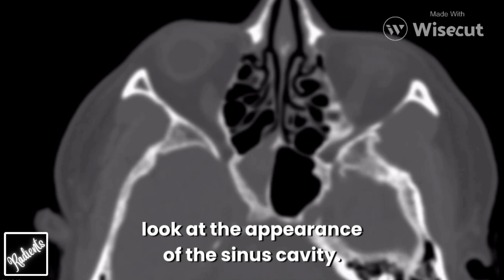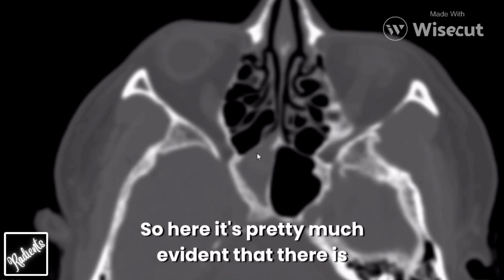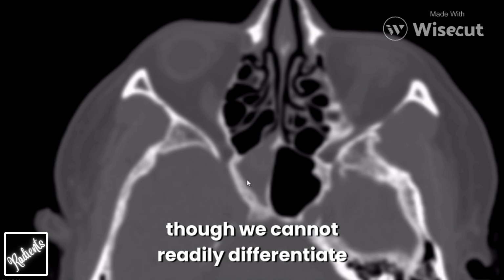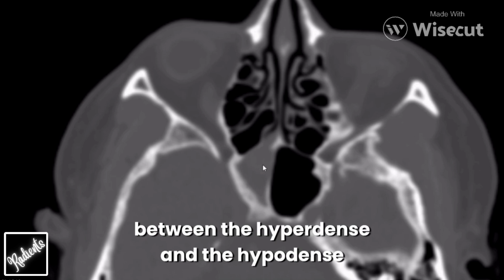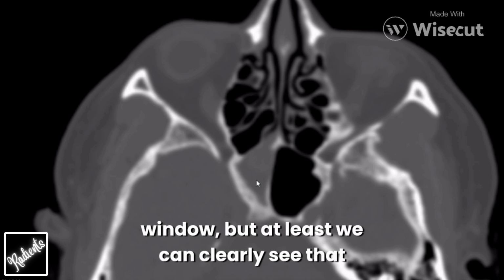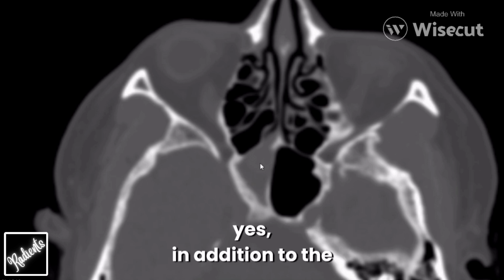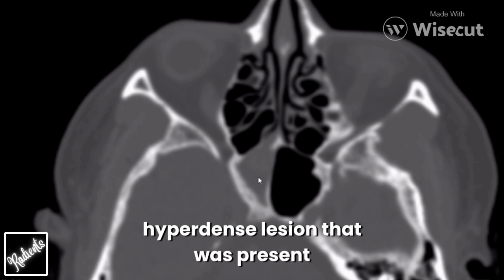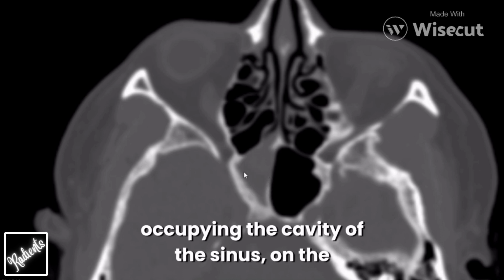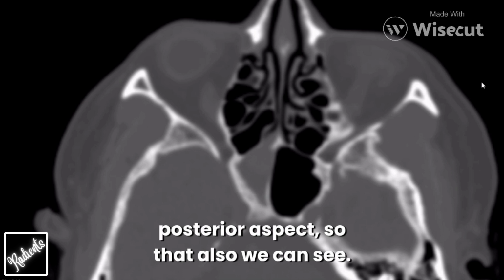Firstly, just have a look at the appearance of the sinus cavity. Here it's pretty much evident that there is something that is opacifying the sinuses. Though we cannot readily differentiate between the hyperdense and the hypodense part, which was clearly visible in brain window, at least we can clearly see that, in addition to the hyperdense lesion that was present anteriorly, there is also something that is occupying the cavity of the sinus on the posterior aspect. So that also we can see.